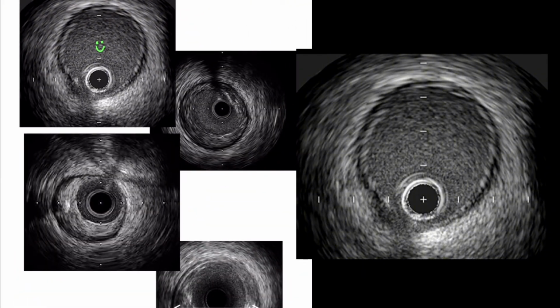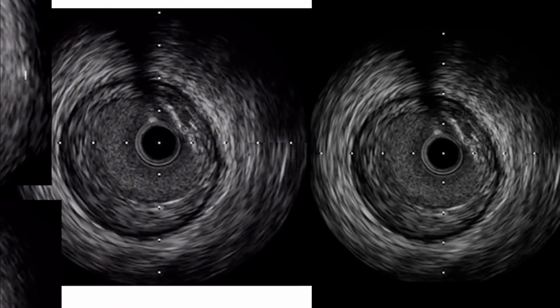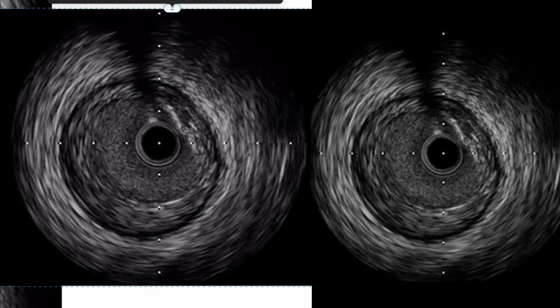Now let's go to this example. I'm going to bring that to the front real quick. Now, don't skip steps until you're super, super comfortable and trained.